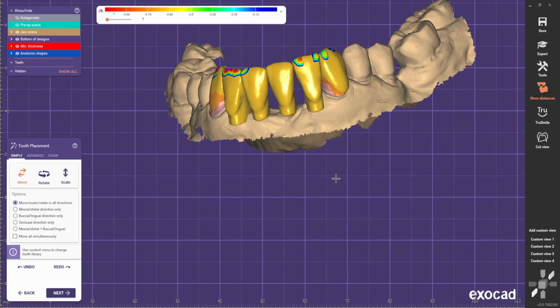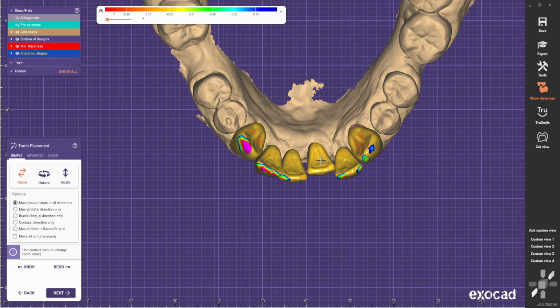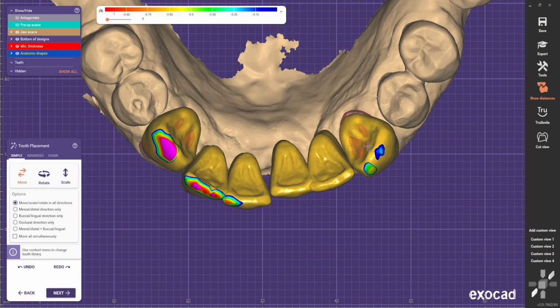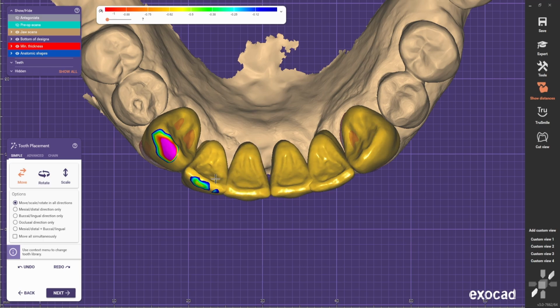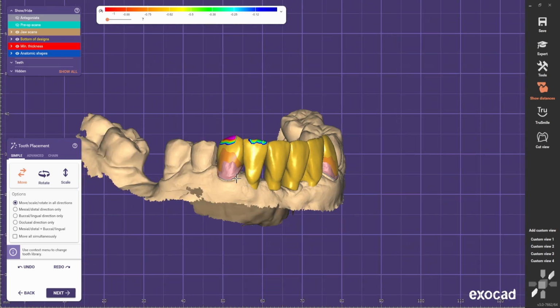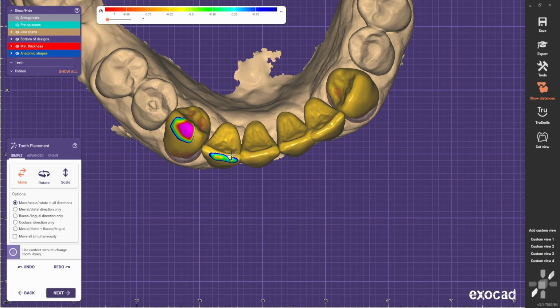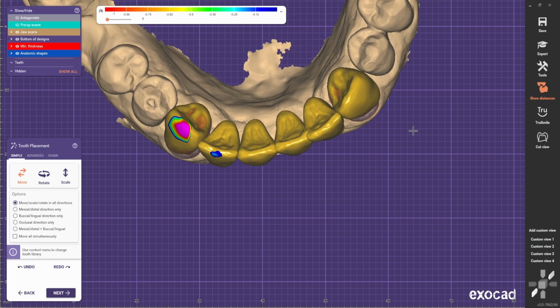So for today's video I'm gonna use this library, the generic one. Although it's not my favorite. I'll just take it as a challenge, because there are much better libraries out there. But for today's example I'm gonna use this because I feel that most people use this library.